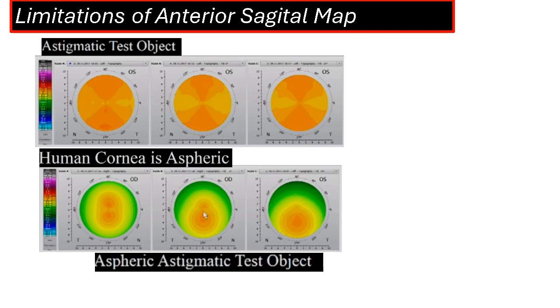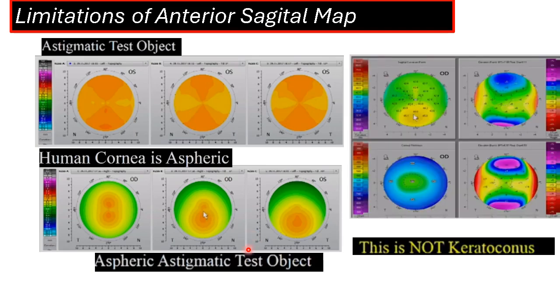So you will have a hint that this is a case of keratoconus. But actually this is not true, because these patients have a completely normal cornea. What they have is what's known as a displaced apex of the cornea. When you look at this patient, this is the axial map after proper centration of the eye.